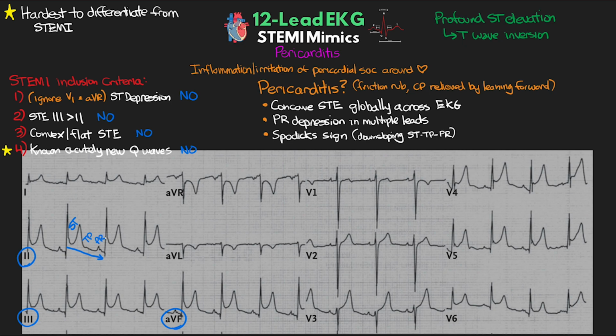All right, well, we covered a lot of different pathologies and morphologies in this lesson, all of which can produce ST elevation and thus mimic our STEMI on EKG. It's important to be able to recognize these and to be able to differentiate them from an acute MI, as we want to make sure we can diagnose a STEMI accurately and promptly, but also to prevent misdiagnosis as well.